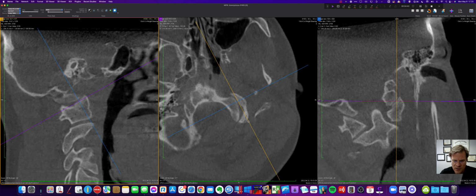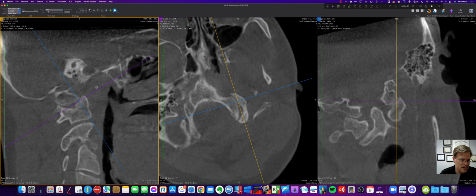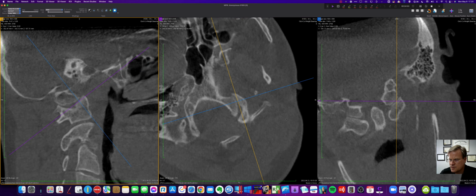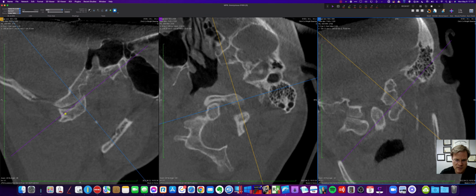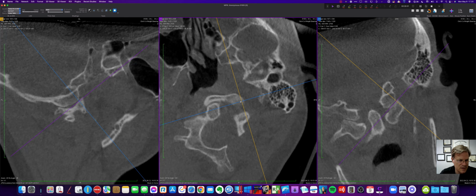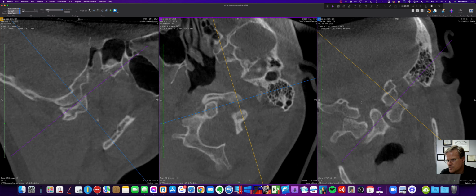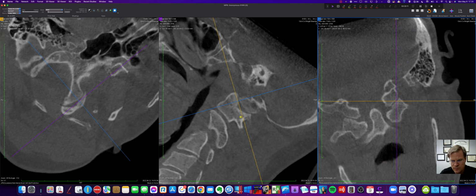Okay, now it does look like we're kind of far forward, so I'm going to decrease that convergence angle. We're still getting an ASR. Now what happens if I decide to look straight along the joint there? Again, something that Dr. Blair couldn't do. Still seeing an ASR. So I'm going to take that out because that's not one of the pictures.